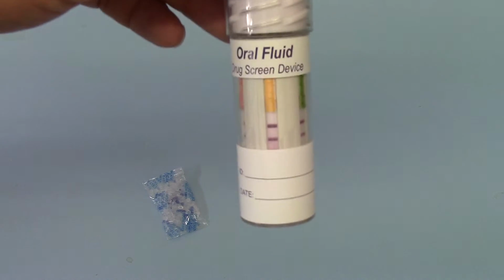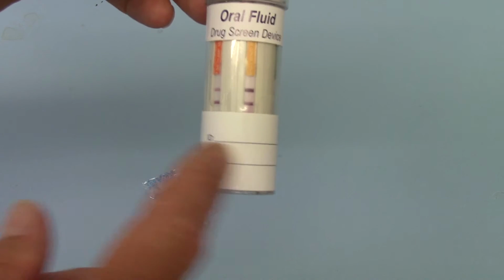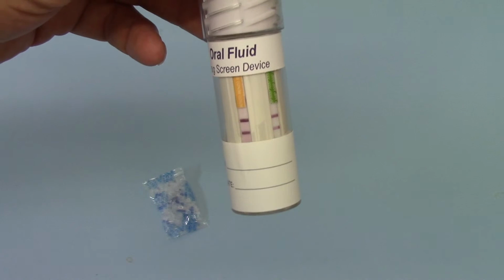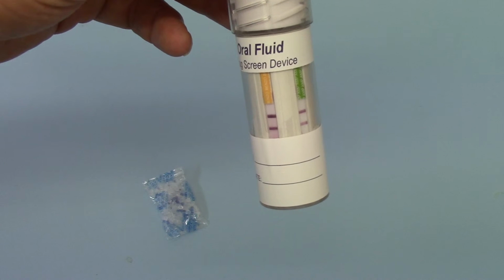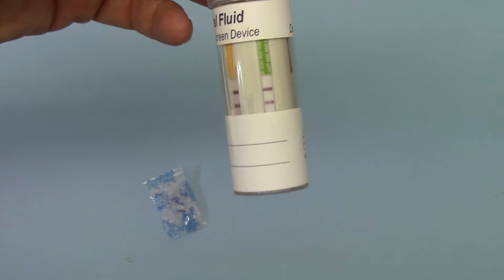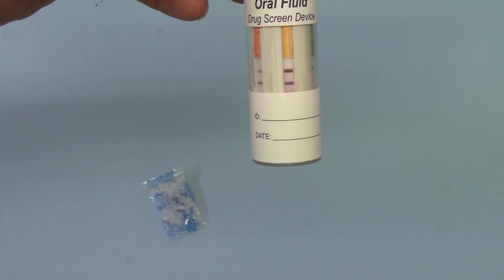Now, if you do have a positive and need to send the sample for laboratory confirmation, this whole tube can be labelled, witnessed and sealed. Security seals aren't actually supplied routinely with these packs, but are available to buy online, which will seal the lid, and that can be signed over the seal and the whole thing sent off for laboratory confirmation, because there should be no evaporation or loss of the saliva once this tube is locked.